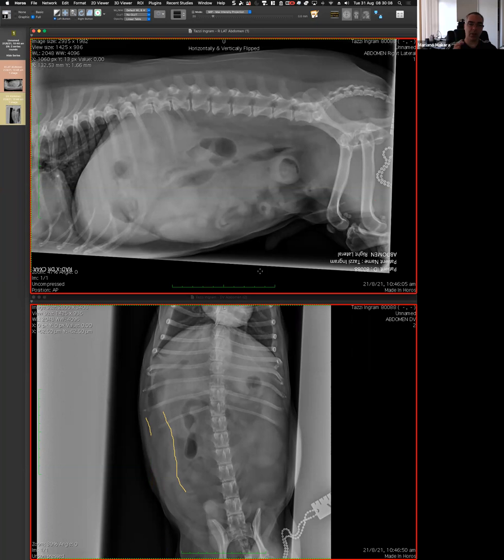The puzzle that we are dealing with now is that we went through different considerations, and I think we all agree that there's something abnormal in the bowel, likely in the small intestine. The content is abnormal, the diameter is abnormal. The puzzle is why this seems to be the opposite situation that we deal with many times, where we see the consequence of the obstruction. We don't see the cause of obstruction. So now we are seeing a distended bowel loop.